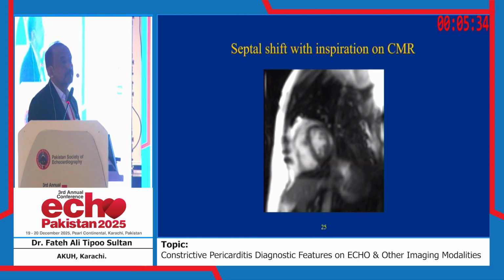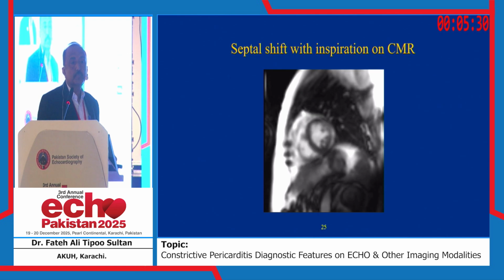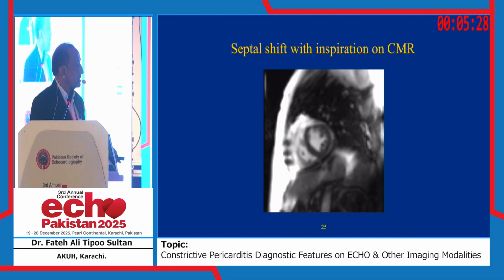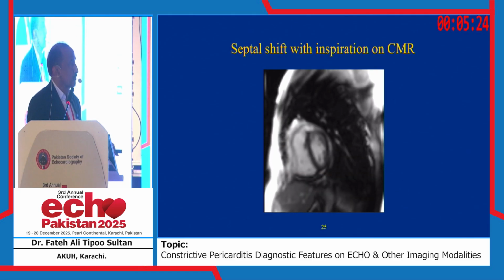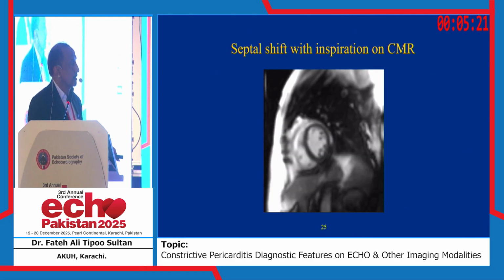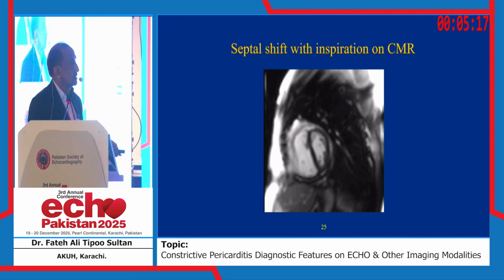So this is the image which is taken without holding the breath. This is the real-time cine image on CMR, and as the diaphragm moves down, it means there is inspiration. So during the inspiration, when the diaphragm moves down, just focus on the septal shift.